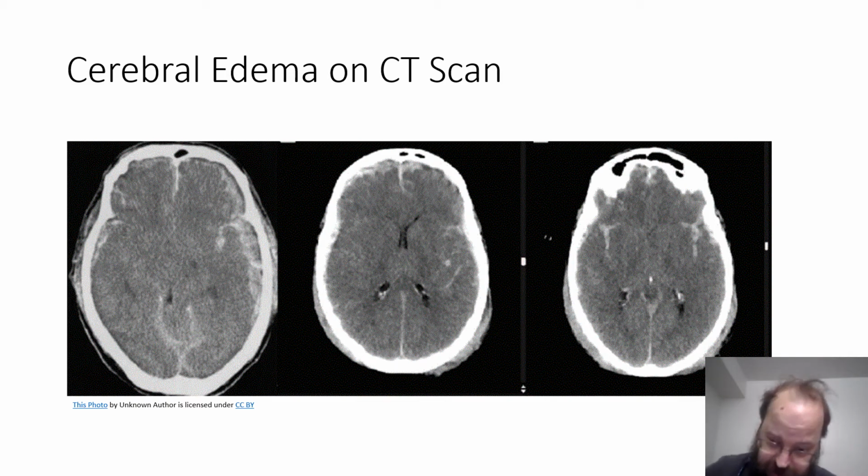And most patients with this suffer a broad-ranging brain injury, and it includes people with not just trauma, but with cardiac arrest, they'll see this, with infections of the brain, sepsis included, meningitis, encephalitis, and this is what it looks like. As you can see, it's not a high-resolution image, but it does show it well enough to say, and you can see that the ventricles are very squished, and that's because pressure's up. This person will probably suffer serious memory deficits, long-term and short-term, because you could see that the ventricles, those dark areas, the long dark lines, are very squeezed tight, and the brain is swollen there.